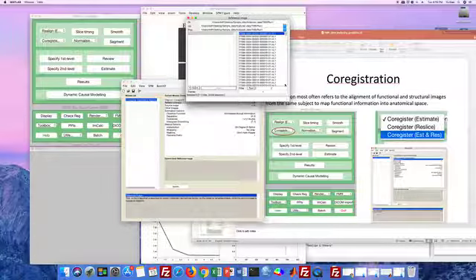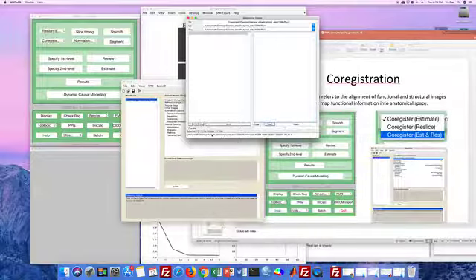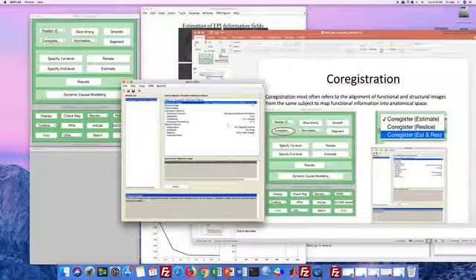We have too many images. It's hard to find the mean image. That's fine. You click this sign, and set up a filter to just select the file name beginning with mean, something. So yeah, we have only one image appeared. Select here, click this. So we select one image and click done.